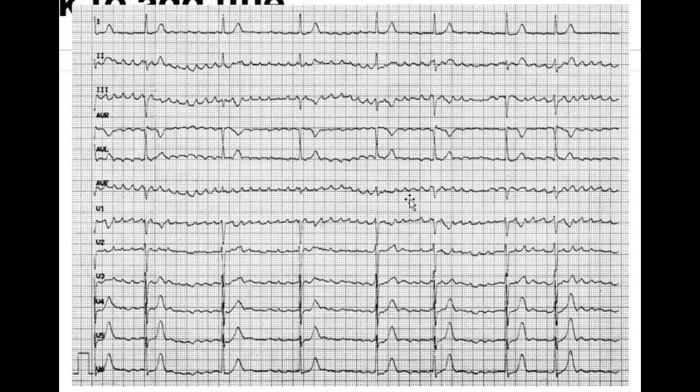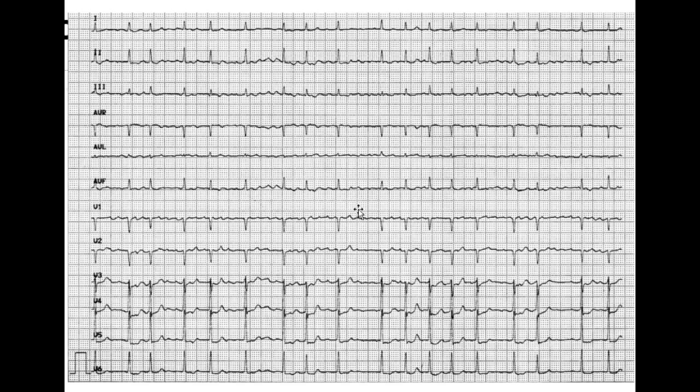And this is atrial fibrillation, which is seen pretty well in leads AVF and V2 in my opinion. And honestly, there's no characteristic way to recognize it. But the heart rate is essentially irregular, the action in this case is irregular.